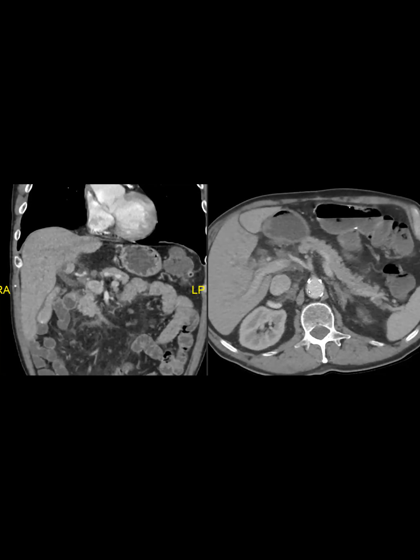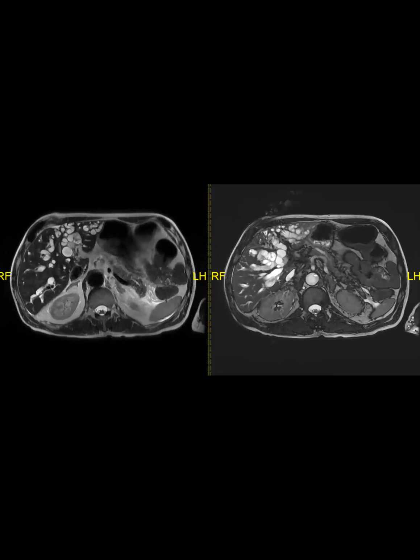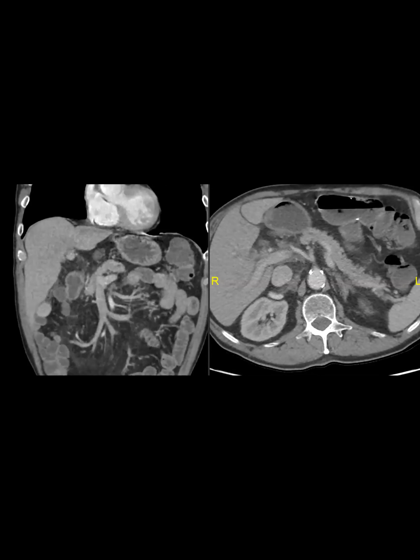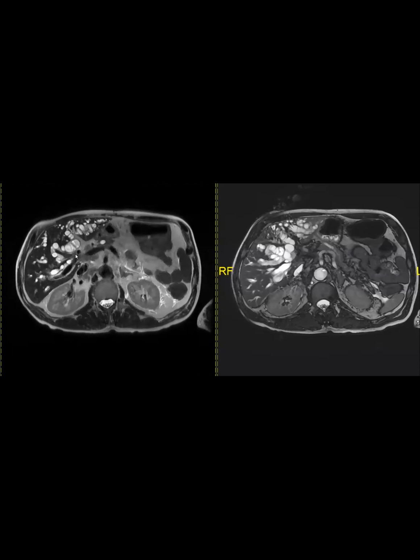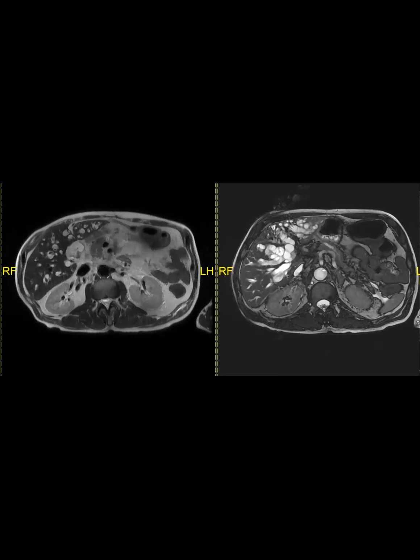So, patient already has one cancer, why would he need another cancer? But since this was an outside study, I had the benefit of follow-up. Originally this was not described in the original report, as it was done for staging. So then this is a follow-up. You can see there's massive biliary dilatation. There's this very ill-defined mass in the porta hepatis, and here the duct now becomes truly dilated and stops at the same level as we saw it on CT.